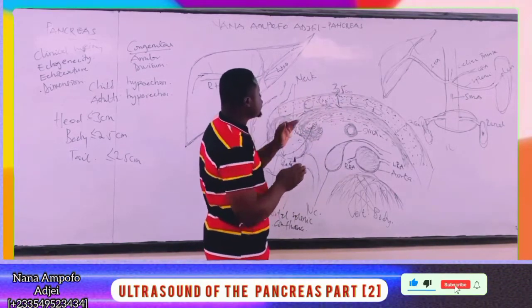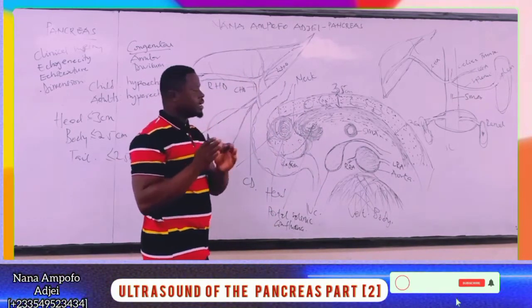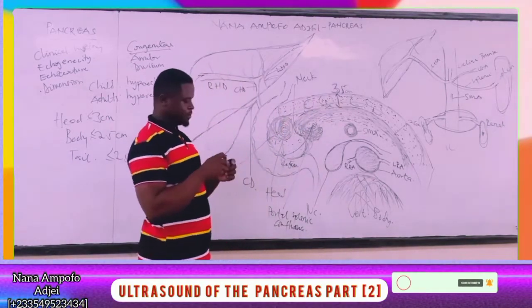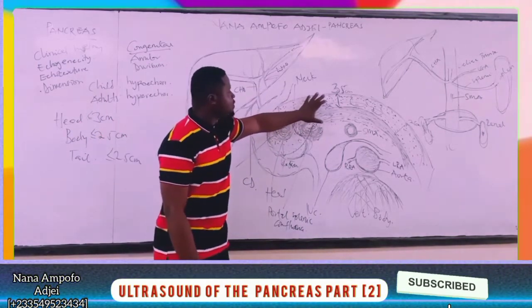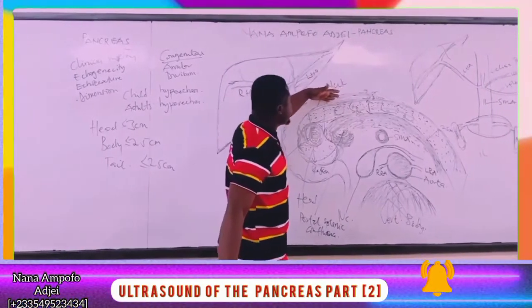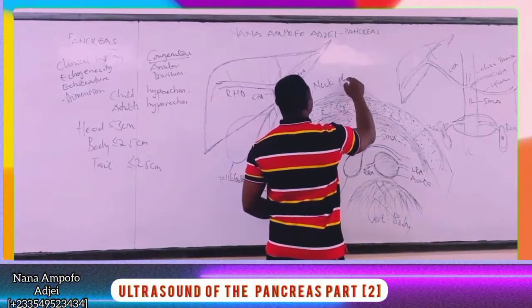So in pancreatitis, we also have those as a result of only fluid, only edema, and then focal pancreatitis. So we have focal masses within the pancreas. That is focal pancreatitis for you. So the size of the pancreas may increase. So we have peripancreatic fluid collection, and phlegmon.